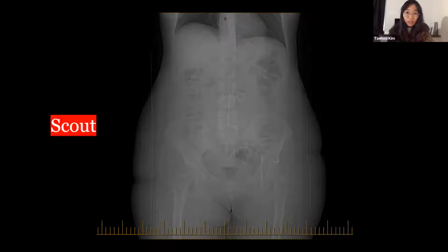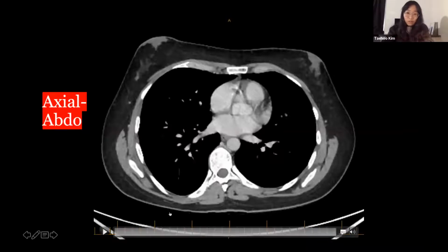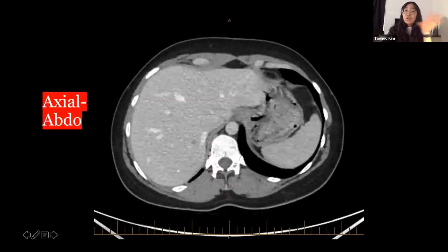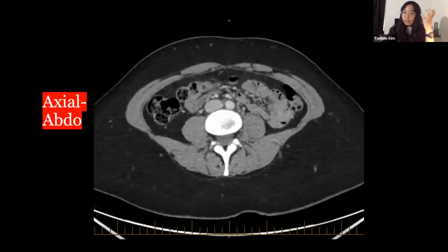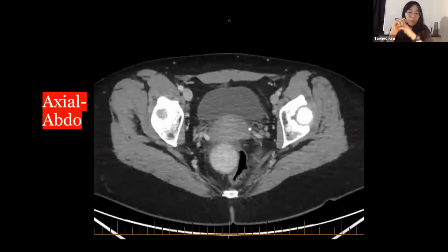What you can check on here is any pelvic fractures, any free air under the diaphragm, and you can look for bowel gas pattern. Once you're through that, I'll ask you to jump to the CT axial view. Here, I don't expect you to go through organ by organ, but really to look for anything that jumps out, anything that stands out: any big inflammation, fluid collection, big fracture.